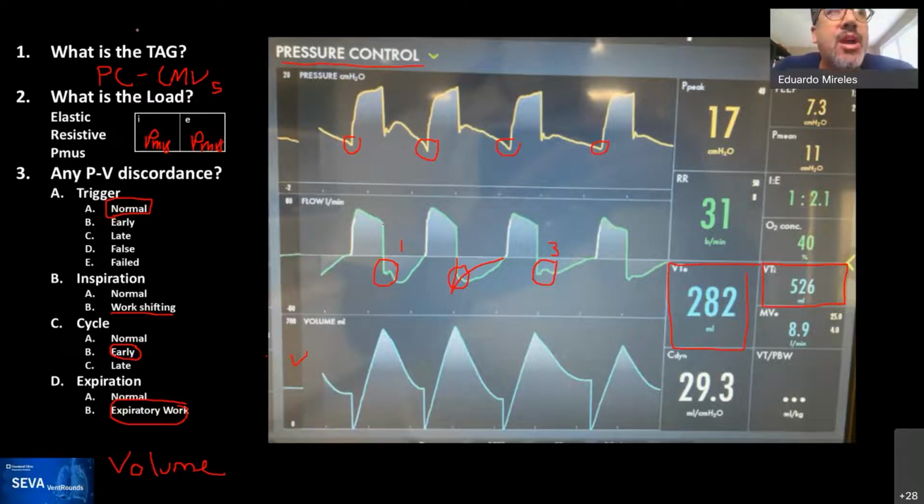And I see Steve put a comment here: what if some of the inhaled volume leaks without entering the lungs? And then Chase says, yes, you cannot really tell the effective tidal volume the patient is receiving, depending on the nature, severity, and location of the leak. Can you? So I opened the question from Steve and Chase: which tidal volume is true? I mean, Chase, they're both essentially true.